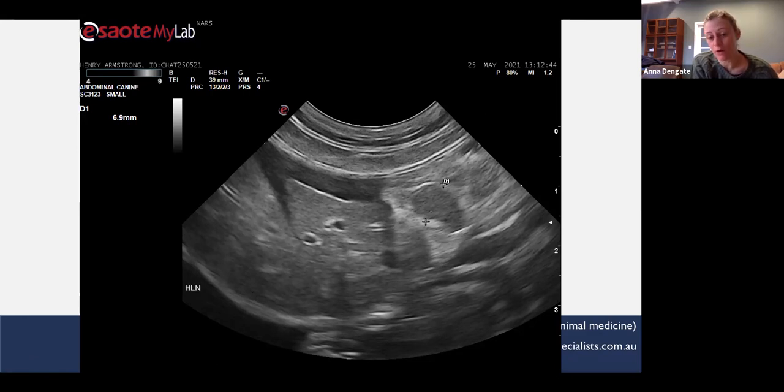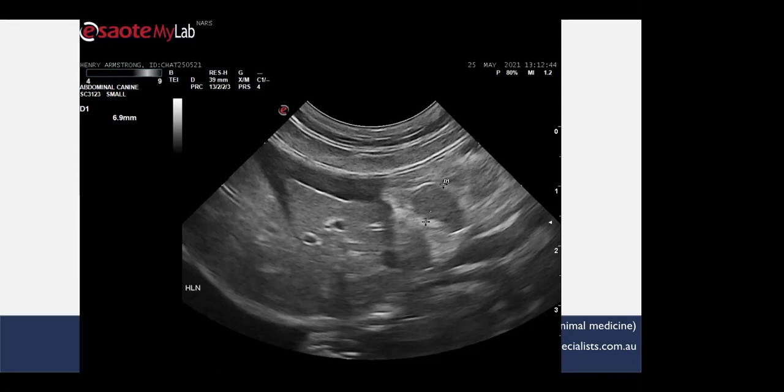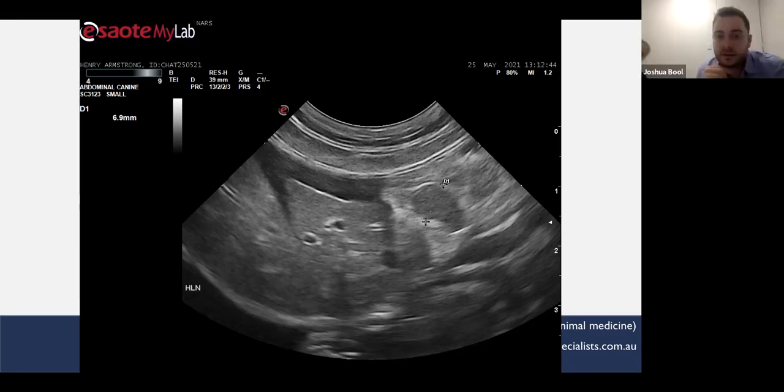So all of your descriptions were perfectly accurate. And I don't want you guys to feel bad about saying I can't comment on this, because when you're actually doing the ultrasound, they're the things you'll be looking for. What do you think about the vasculature throughout the parenchyma of the liver, other than the main portal vein I've pointed out? You know, the portal vessels. The borders are quite hyperechoic, but that's normal.